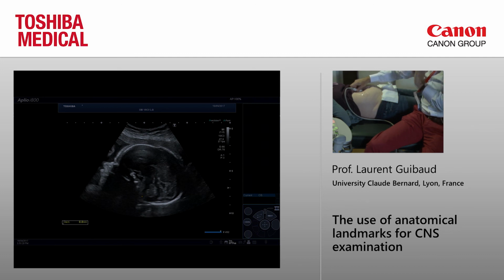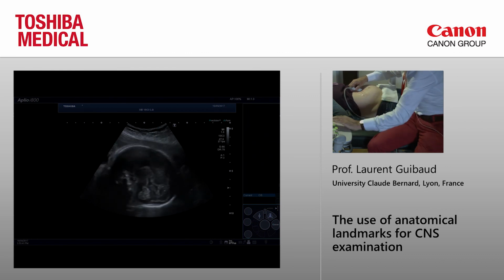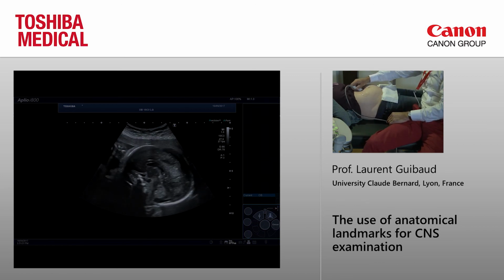Because I do all the measurements on ultrasound except for the brainstem, which is more difficult to get with ultrasound due to, you see here, you see clearly that the bone here is more echogenic. And if you have to measure, it's difficult to know if I have to go from here to that. So I prefer to measure with MR. Okay, but to measure the vermis height, it's easy.